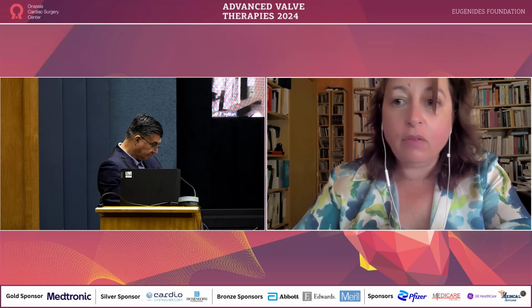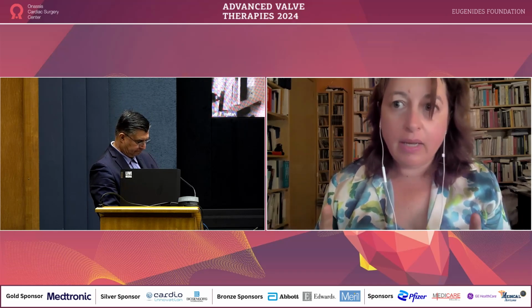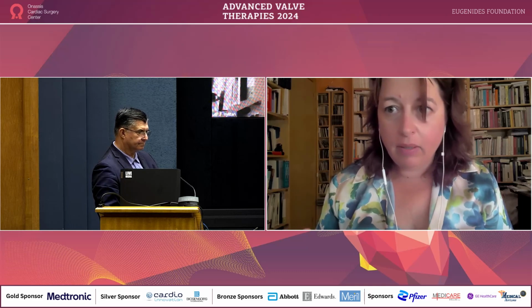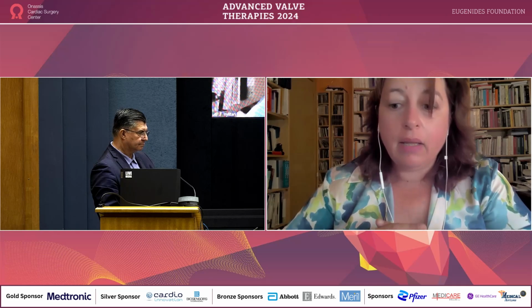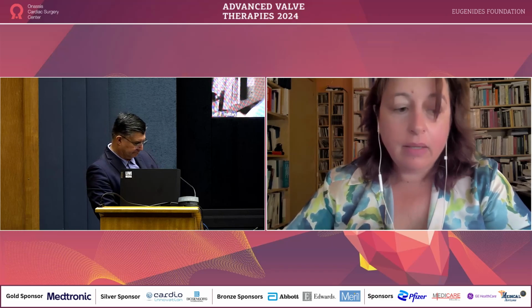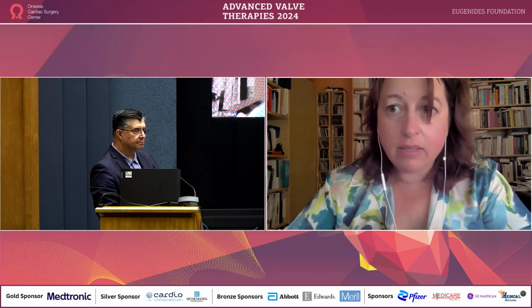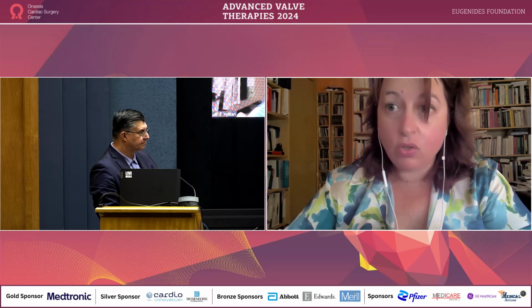And using a 3D data set from a single sequence, it can give you all the data to reconstruct at any available angulation or plane. Most recently there was an interest on how to quantify the paravalvular leaks, and it seems that the echo underestimates in some difficult cases. So CMR is promising on quantification.